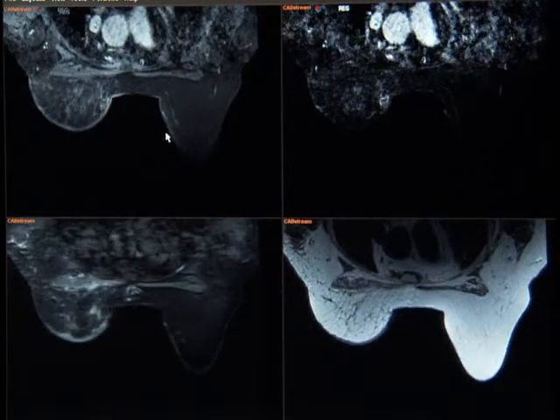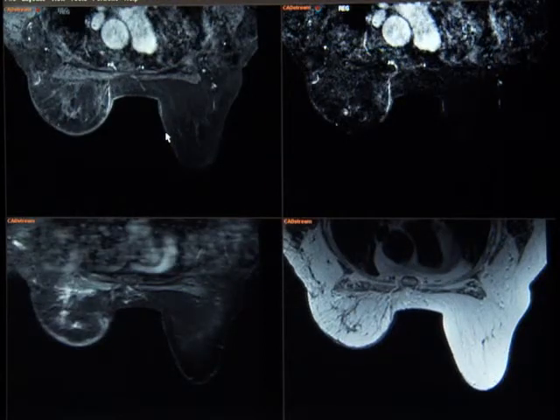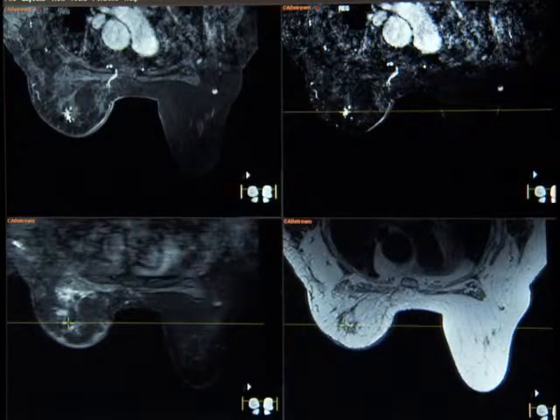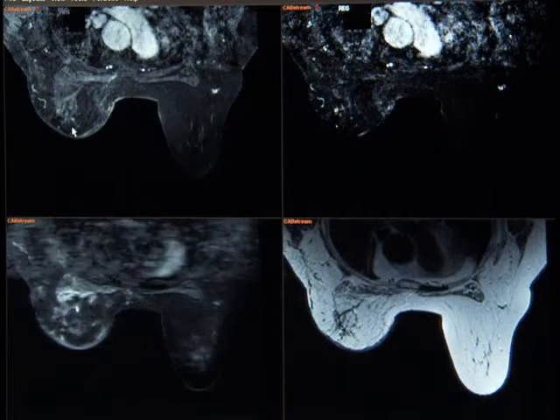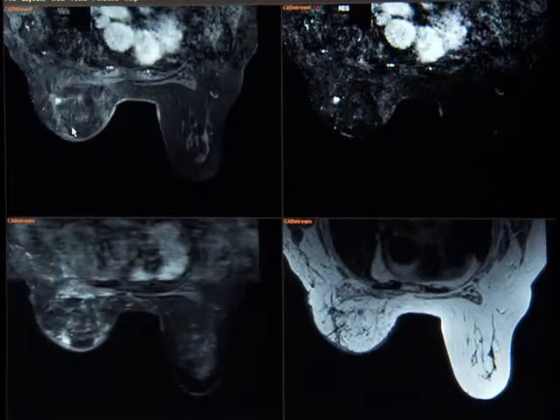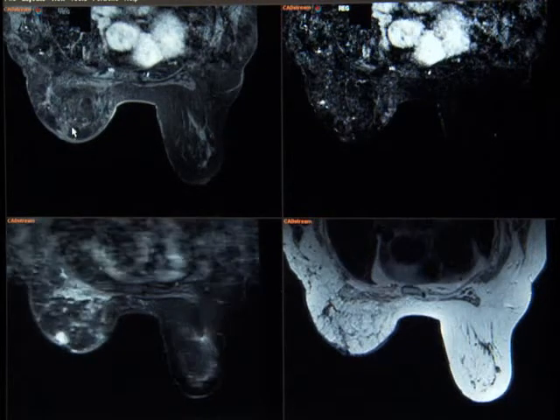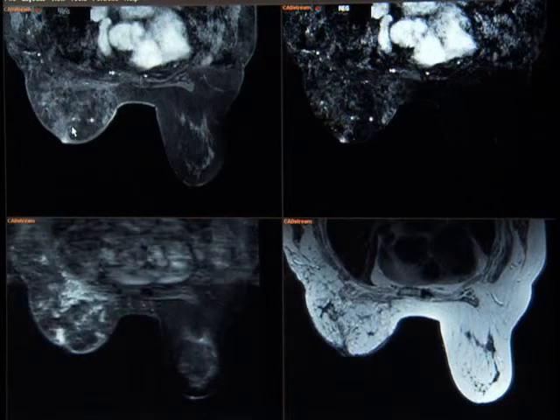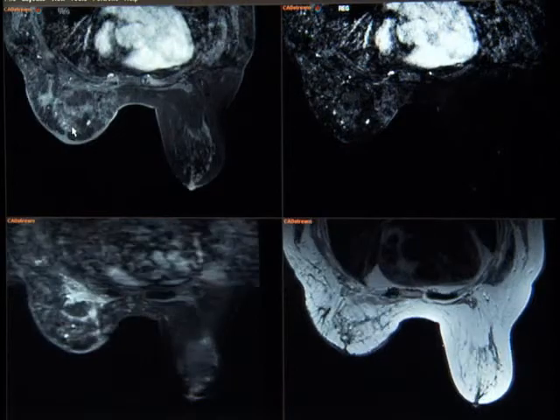In this menu, you look at the individual raw data simultaneously cross-correlated with other pulse sequences. As you pan through, you can see the individual foci of enhancement. Again, you can apply color parametric mapping and cross-correlate with your additional pulse sequences. This allows you to survey slice by slice through your images, simultaneously looking at all pulse sequences. This is one of the tremendous values of a CAD system, in that it can correlate multiple pulse sequences simultaneously rather than trying to sort through them individually.